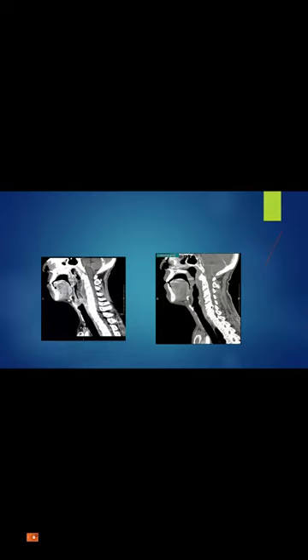So here there is, this patient was being treated for, I think, lymphoma, and this is before and this is after. This is 3 months prior. And the difference here is that this tumor now has ulceration. So the patient improved everywhere, but there is ulceration here and bone erosion that you can only see, or see better, if you do the sagittal.